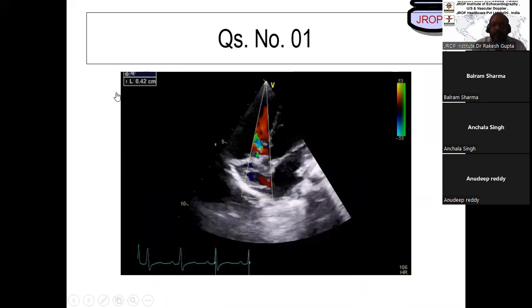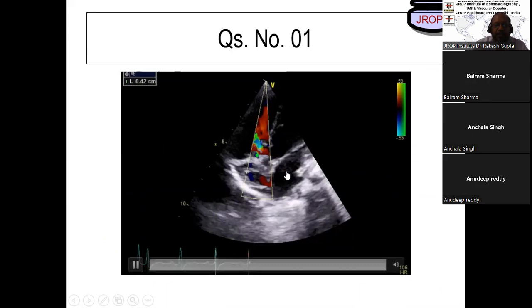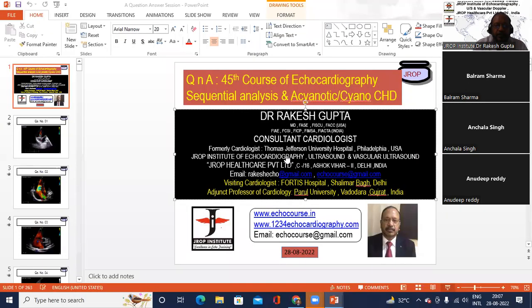Yes, sir. I'll put my arrow so that you can identify the structure. It'll be easy for you. Left atrium. Just a second, start showing it. You see that the arrow is revolving for some time.